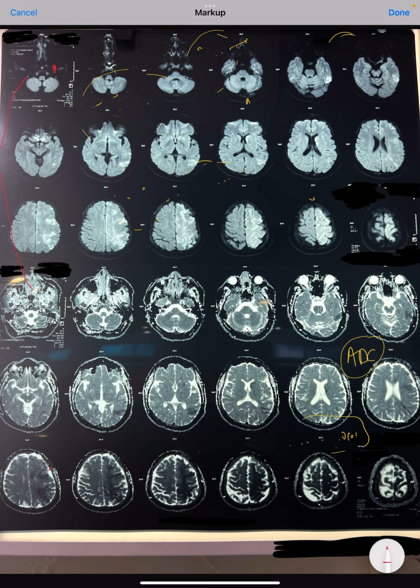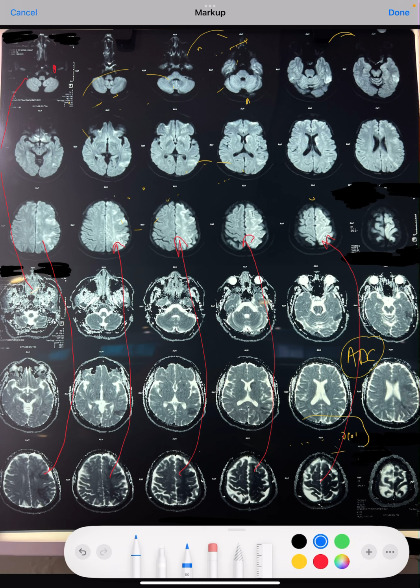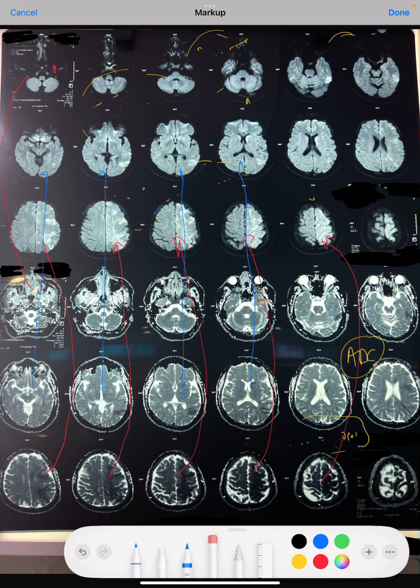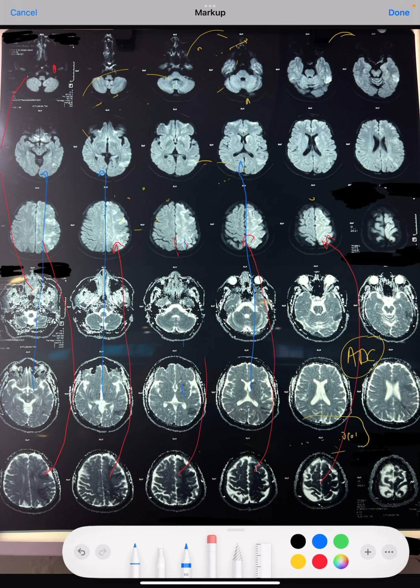This corresponds to this, and so on. The same way the other images correspond to that part, like this corresponds to this, for this, for this, and so on. So what we see, a dense white structure should look dense black on the same respective image.